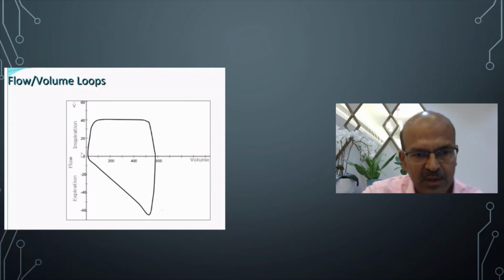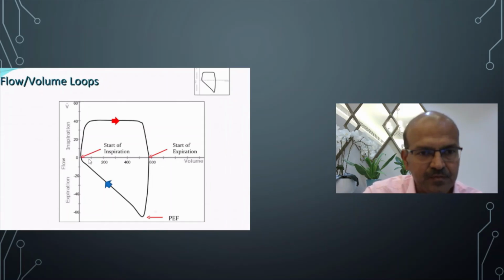Try to see with the ventilator breath where it is going with the inspiration, and then you can figure out whether it is up or down. In a couple of diagrams here, the inspiration is upwards and expiration is downwards. So we have the inspiration, we have the expiration. Expiration being a passive process, once it starts coming down, it continues dropping and it reaches the baseline here. So we have the start of inspiration, the inspiration completes, the expiration starts, the peak expiratory flow happens, and then the gradual drop till it comes back to baseline.